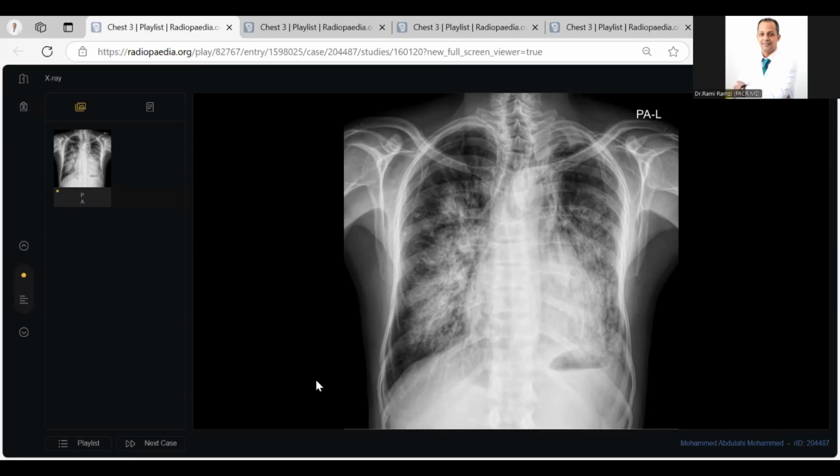It could be alveolar proteinosis. I think the differential is alveolar proteinosis or microlithiasis, less likely. It can be congestive heart failure. Yes, look at the heart. Non-cardiogenic and cardiogenic. I think cardiogenic causes most of all, and then non-cardiogenic as well.